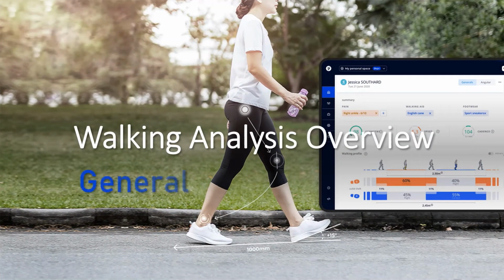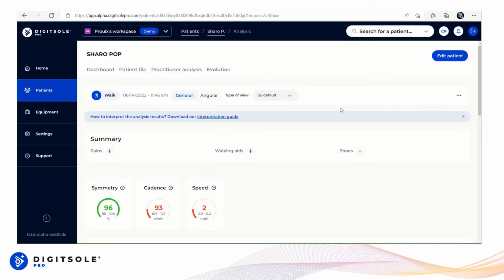This is going to be a quick overview on the general aspect of the walking analysis. All right, so here we look at the dashboard, and up top you can see that there's some patient information, as well as some of the control features that we'll cover in another segment.